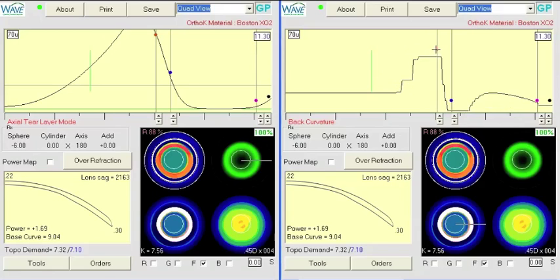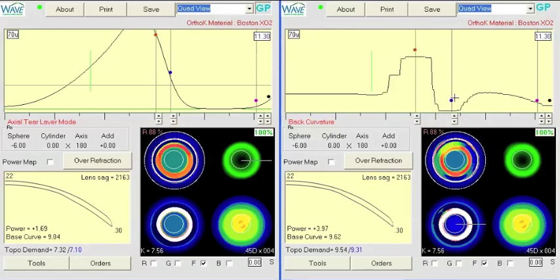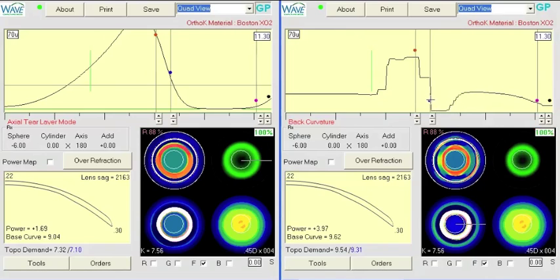We can decrease it by 0.9. So what I'm going to do is just drag the OZ and reduce it 0.9. It'll be 5.3. I'm keeping the lift the same, just changing the size of the zone. And then this one will go to 5.9. Okay, so we've shortened the OZ, and we have more lens available for alignment.